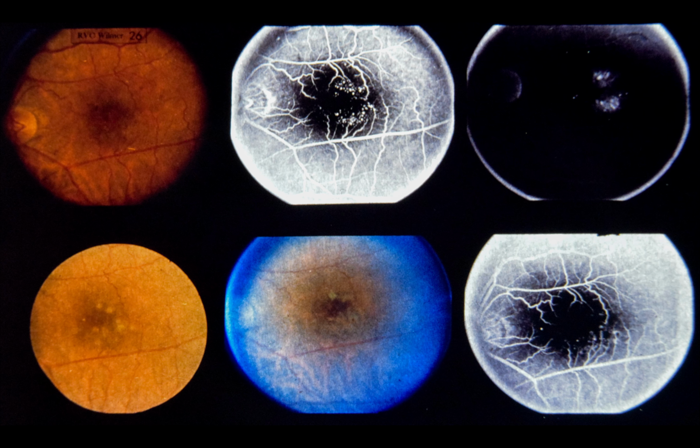Exposure time was 0.1 and 0.2 seconds. Lower left is a photograph taken immediately after photocoagulation. 3 months after treatment, visual acuity improved to 20/20 and has remained 20/20 for 3 years.